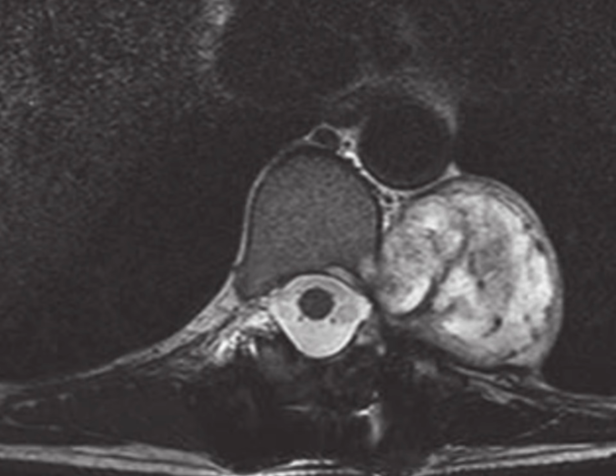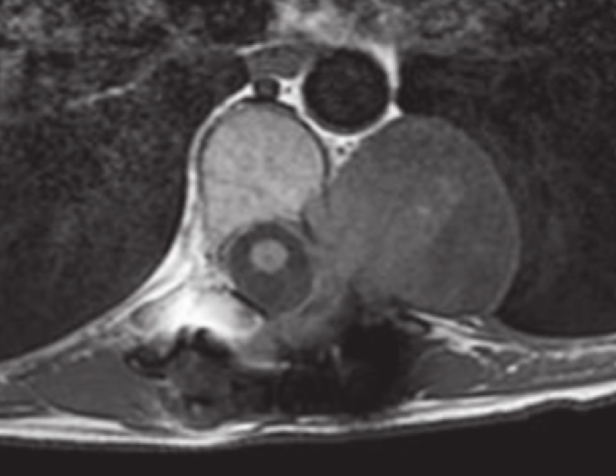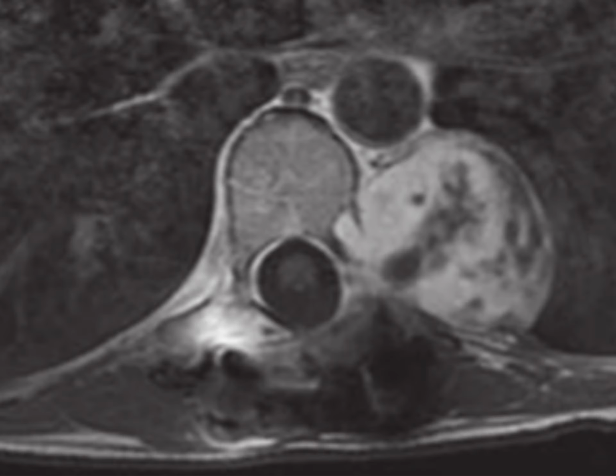The signal characteristics are telling us a lot here. T2 hyperintense and T1 isointense compared to muscle, with some cystic components in areas of non-enhancing necrotic tissue. All of this points strongly toward a neural tumor, likely recurrent given the history of previous resection and spinal stabilization.